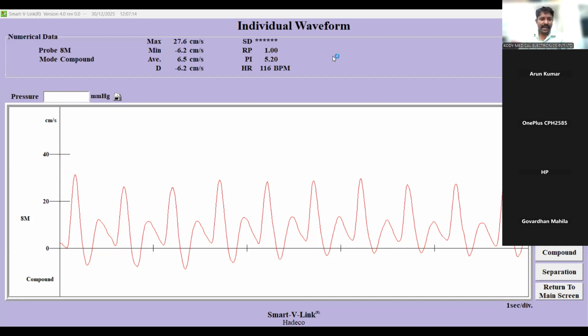There is a problem with the artery, and narrowing of the arteries takes place. Okay, so I'm moving to the next slide. You can see how the triphasic waveform is visually displayed. This sound also should be heard very prominently. But we are not hearing anything, nothing.